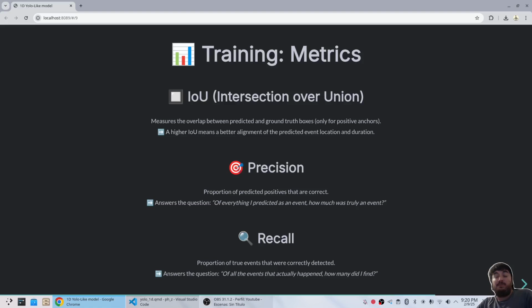For trying to evaluate the training procedure, we are implementing a few classic metrics: intersection over union during training, the precision and recall, to try to see how well we are matching these events. So of course we have really few events with respect to the complete set of studies, so it's probably needed to tune the threshold to have a proper detection rate, and not under predict or over predict a lot. But this will be part of the evaluation, also comparing to the around 60% that has the per timestamp model that we will cover later.